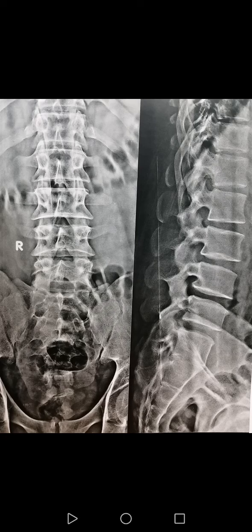Bismillahirrahmanirrahim. This is the first video of a new series aimed to comment on some imaging, MRI, X-ray, CT, and so on regarding rheumatology and musculoskeletal system.